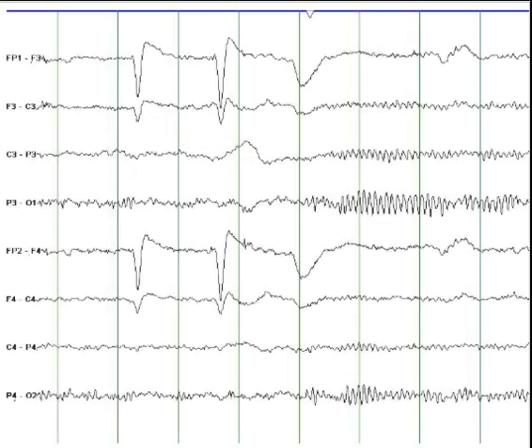When you're looking at the EEG, a quick reminder, you look at the left hemisphere of the brain. So all the odd numbers here, let me mark it down. These are all odd numbers on this side. These odd numbers tell you that you're recording electrical activity from the left hemisphere of the brain.